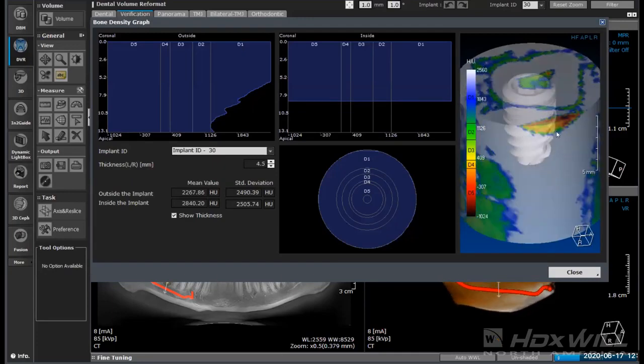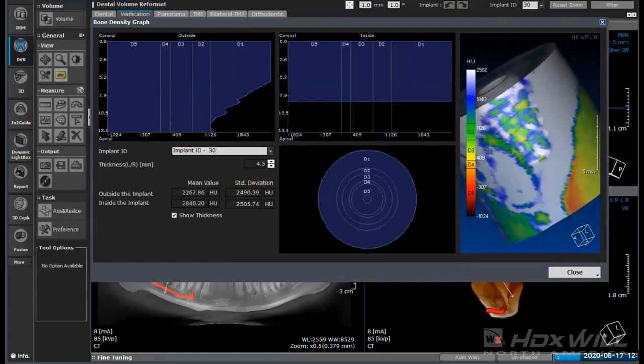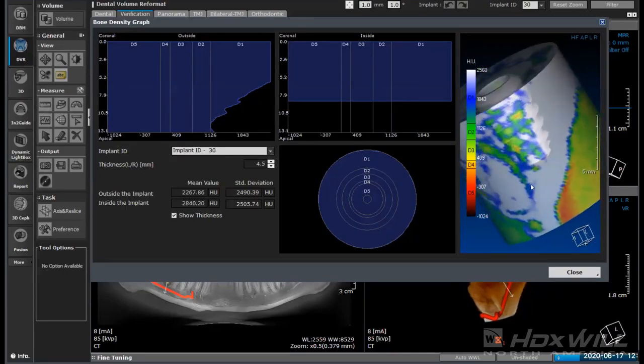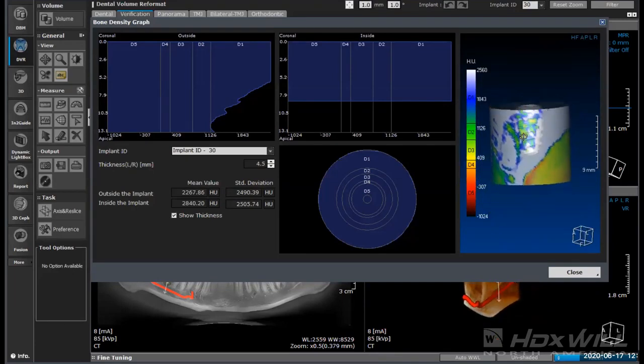I like to find correlations as to what I'm seeing when I'm looking at these. So like this image right here, we're right at the gum line. So more than likely, that's just where the bone ended and the soft tissue began. Also nice is that as I turn this over this way, we see that patch that's all the way over here. So let me go ahead and get this here, and then I'll turn it this way, that we see that patch that's right there.